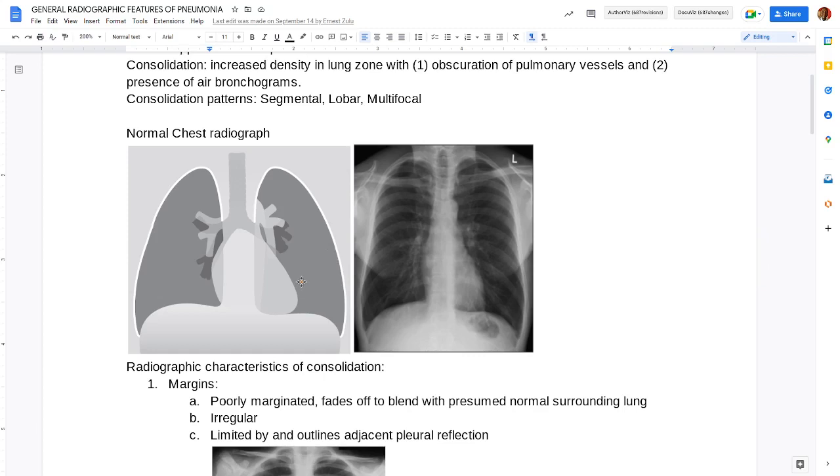Now I want you to go to the opposite side, the other side of the heart, which should be the right for the patient and the left for you. You see the margin of the heart, the border of the heart. It looks very clear. You can actually follow it, starting from the top, it curves down all the way. Have you seen how sharp that margin looks?